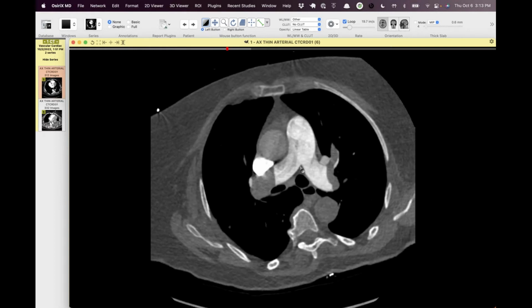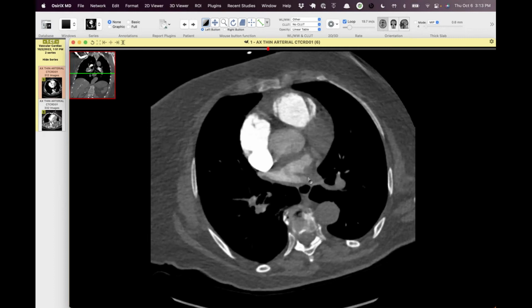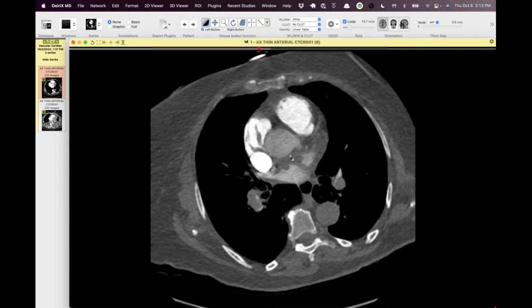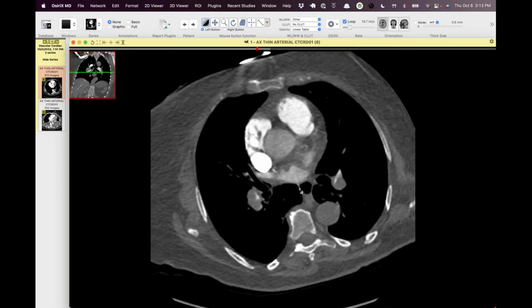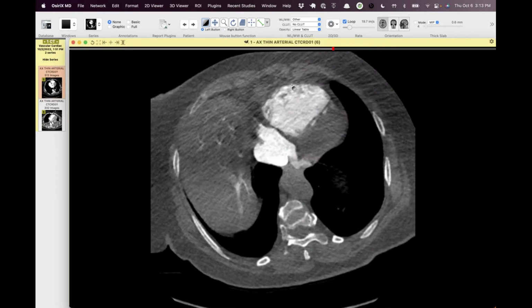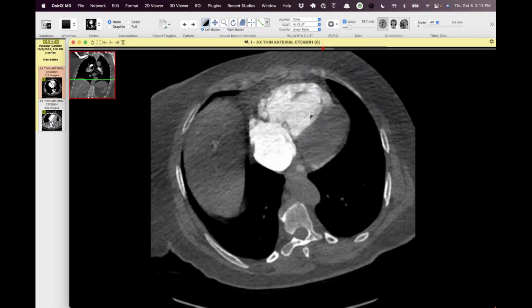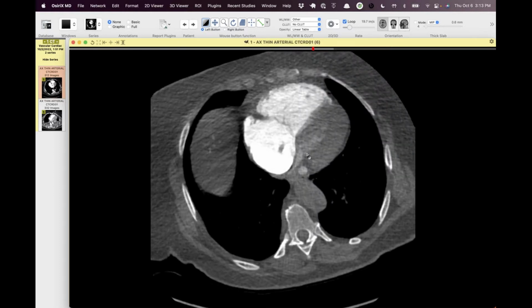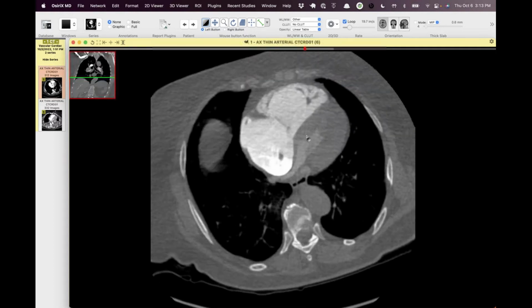And they've even got a little bit of slow flow and smoke to go along with that, and some mixing in the left side and in the aorta, as there's not much contrast that's made it across. But this patient does have some signs of elevated right-sided pressures. And, as I remind my residents and fellows, especially in this setting, always look for a PFO.